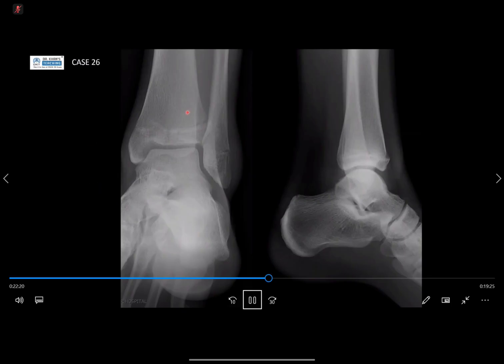So there is soft tissue swelling, okay. Certainly on the lateral aspect, maybe you can say a little bit on the medial, just because, to my eye, they look a little bit more full compared to normal fat. But there's definitely more on the lateral side than the medial side. So I usually take a kind of big eyeball, subjective measurement. So this is quite small and this is big. So you say more on the lateral side.